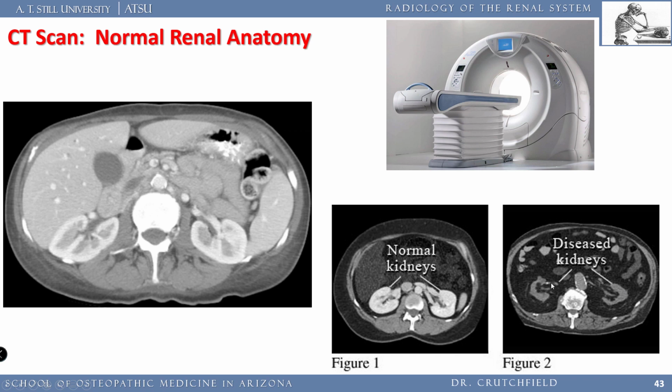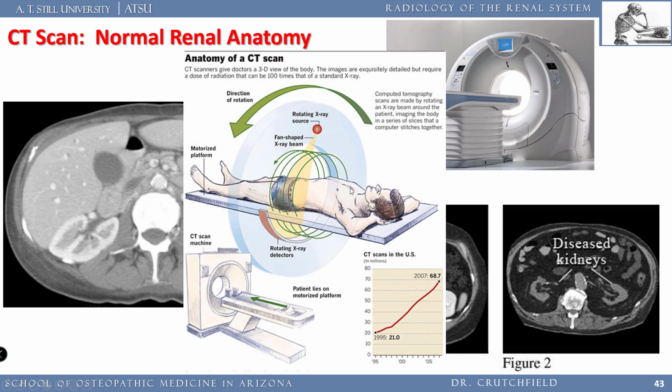So these are obviously diseased kidneys. They're shrunken, they're shriveled up. They probably don't work very well. This might be somebody who has total kidney failure and is on dialysis, and their kidneys just basically atrophy with time. They're not getting used. So again, if you want to go learn about CT scans, this is a tomogram, but the radiation source, instead of swinging back and forth across you like an IVP, rotates around you in that great big giant gantry, is what we call it.